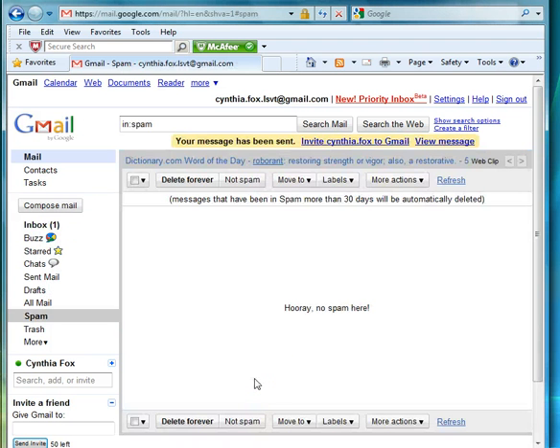Once the client receives this email, they'll simply open the email and then move that target file into their data folder, which looks exactly like the data folder on the Clinician Edition, and that will automatically update their system to the new files that the clinician has set.